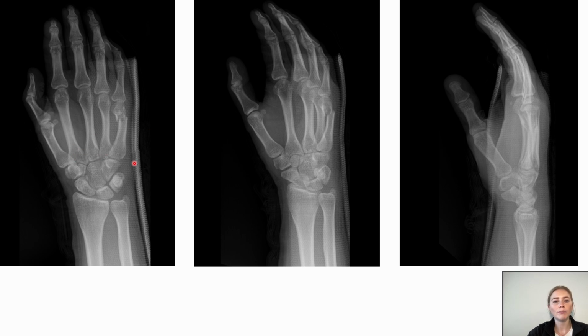So once we've finished with the metacarpals, I don't see any base fractures. We can go down to the carpal bones. We look at the A's. So the 4 A's are arcs. We see that the 3 arcs, the Gilula lines, are nicely aligned there on the PA view. I don't see any step-off deformities.